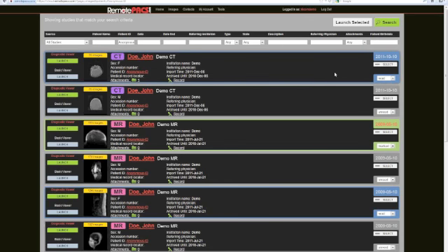The first one I want to point out is the status of, it's called state or status of the study. If you're using this and you're having a reading radiologist come in and log in and read, you can have the radiologist mark a study as unread or read, or if you guys wanted to define some other meanings, you can either mark it as marked or as attention. And this will change the color, and in that way, if you guys predetermine what that means, somebody will know it's stat or whatever it means. So I'm going to go ahead and mark this one back to red.